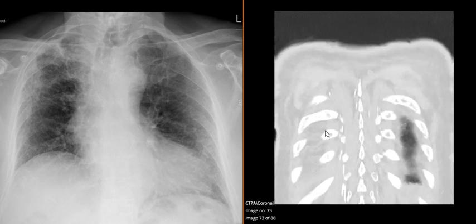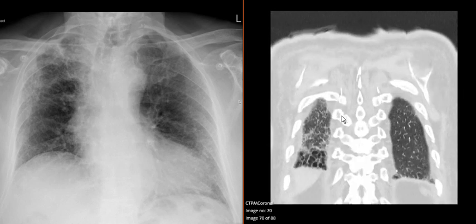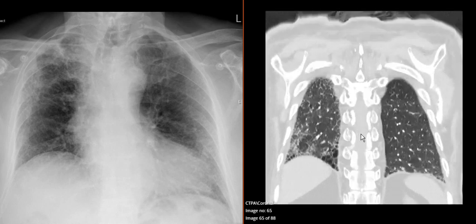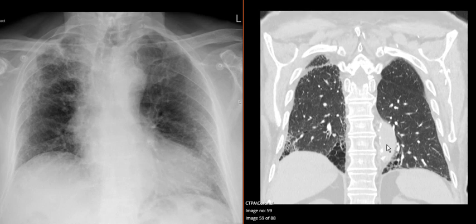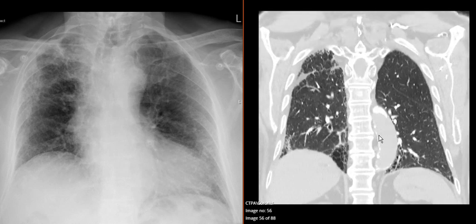So those are the ribs at the back, and then the ribs attached to the transverse processes as they come up, spinous processes, spinal canal. These are the scapulae either side. And then we get this structure here, which runs down the left-hand side. Here, this is the left of the vertebra, which is actually the aorta.